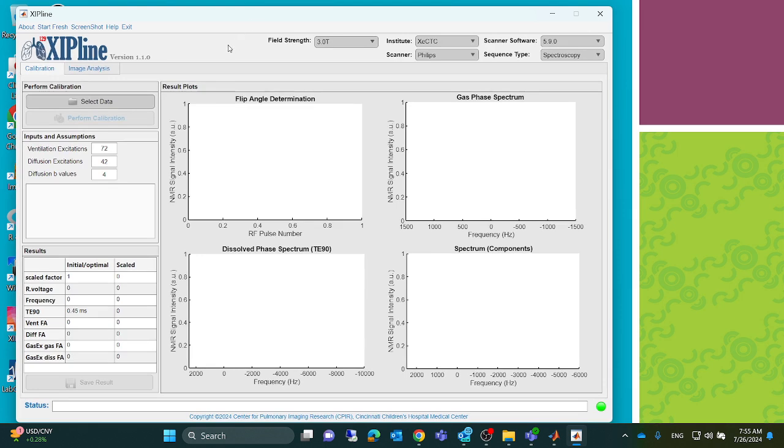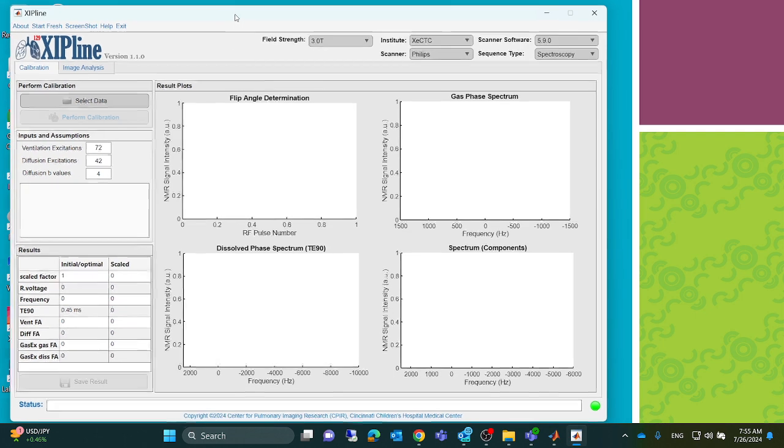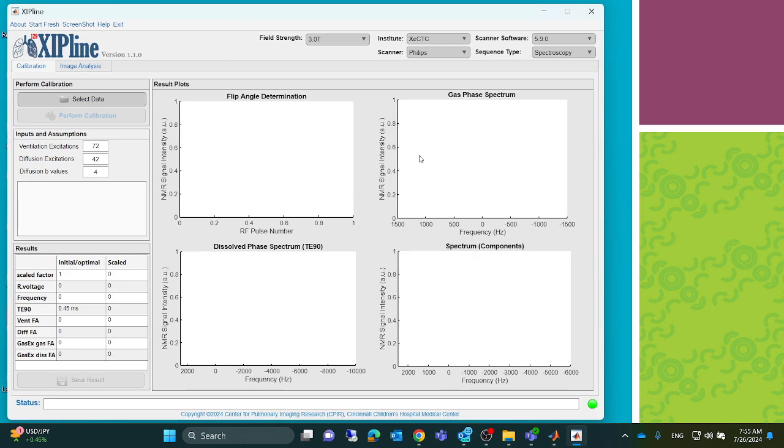While this one provides a nice, clean program that you can use daily, for more sophisticated and advanced features, you can customize the application, add, remove, edit codes, and all these things through the developer mode. That's one.